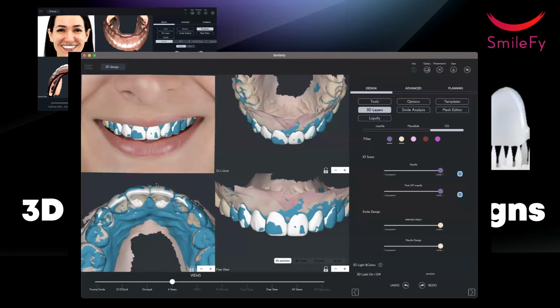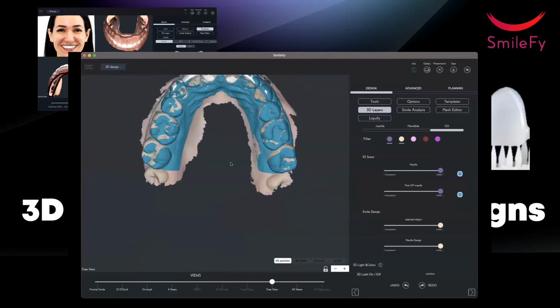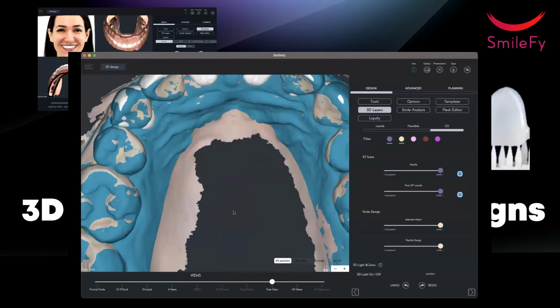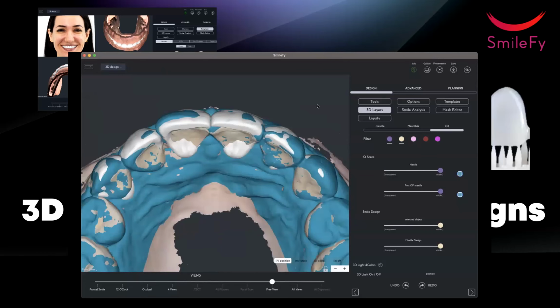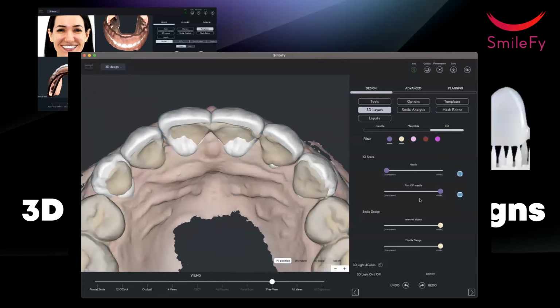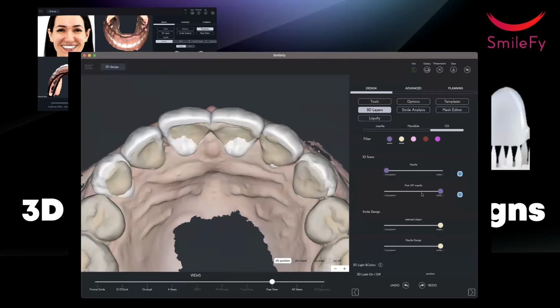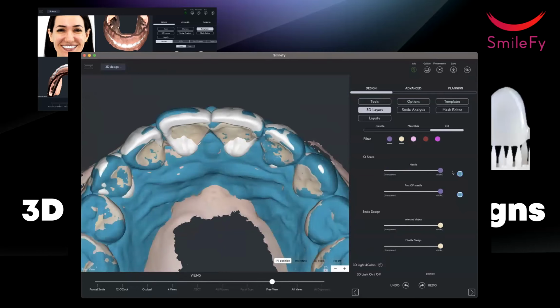Usually you see when you have something like this, you can check with the prep and the design, very important, whether you lost lip support for the centrals, right? Because what can happen is that when you prep and you design, you can eventually design way too lingual. And then you lose lip support, and maybe you miss 1.5 millimeters, and then suddenly the lip collapses, right?